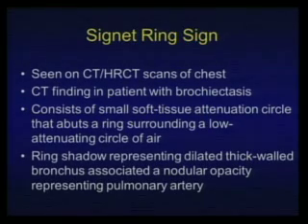So when we have a dilatation of the airways much bigger than the artery, and the relation is greater than 1:1, because normally the relation is 1:1, the same size for the pulmonary artery or arteriole and the bronchus or bronchiole. When you see that the bronchus is larger than the artery, you have a bronchiectasis.